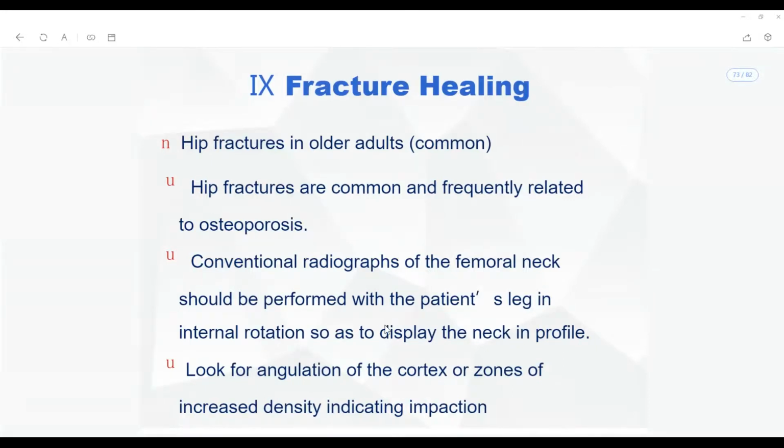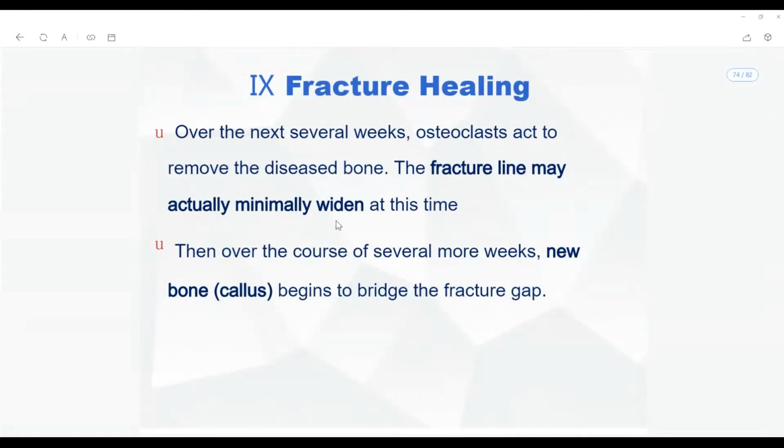And you see here, and then here the callus bone actually starts to heal first. Okay, the first one, how the fracture healing may happen. Okay, the fracture line actually minimally widens at this time for the first few weeks because of the activation of the osteoclasts.